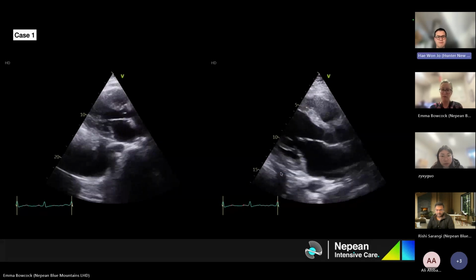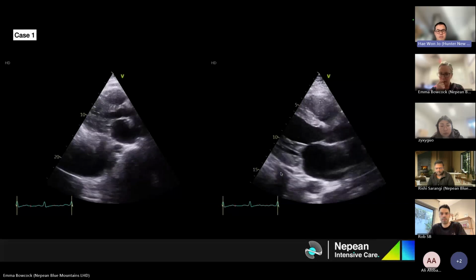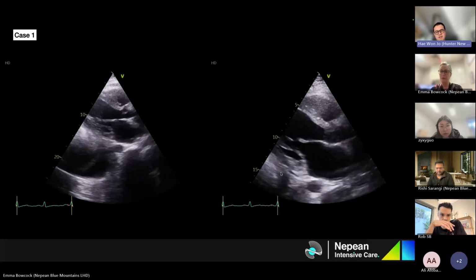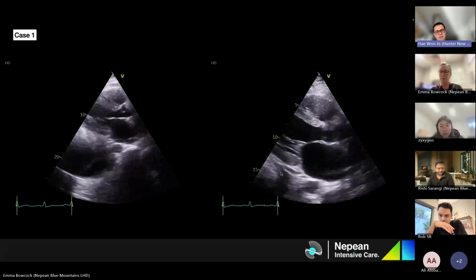Okay. It's a very abnormal echo for a woman in third trimester. There's a large left-sided pleural effusion, and I'd expect LV to be hyperdynamic, but LV function's impaired. So we're looking at anteroseptal and infralateral wall. I don't think there's a regional wall motion abnormality. I think it's global. LV's dilated and at least mildly impaired. Actually, I'd call it moderately impaired. LA also looks dilated. The RV outflow tract also appears enlarged.